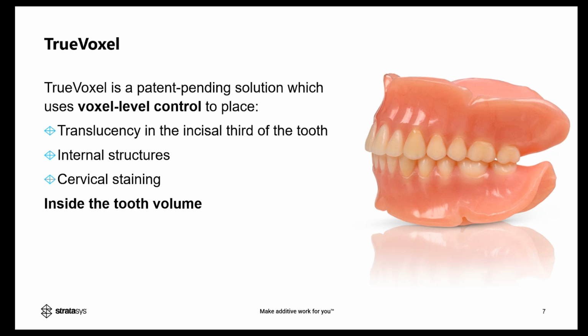You can expect the same accuracy that you're used to seeing with TrueDent. And the important thing to understand here is that this is not painting or staining or anything that is happening after the fact. This is hard baked into the model. This is making the design repeatable and scalable, and you can expect the same exact result every time you come back and reprint these models without any additional manual labor that is currently needed for characterization on teeth.